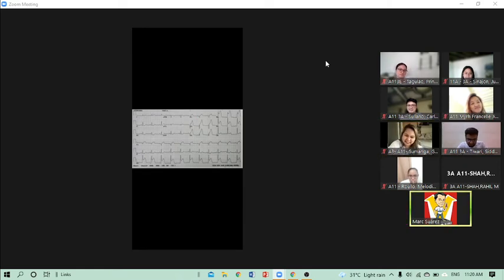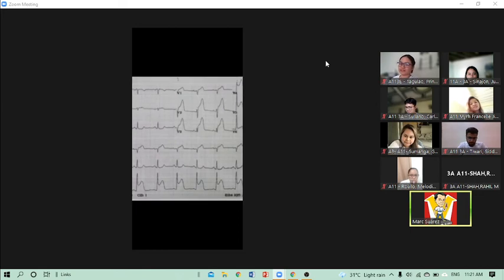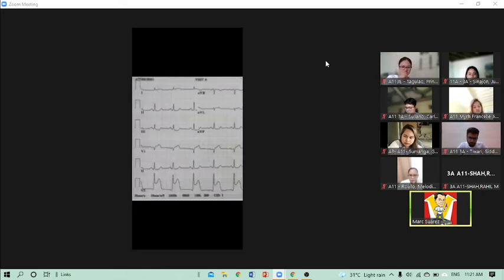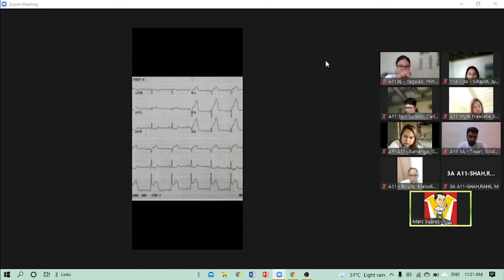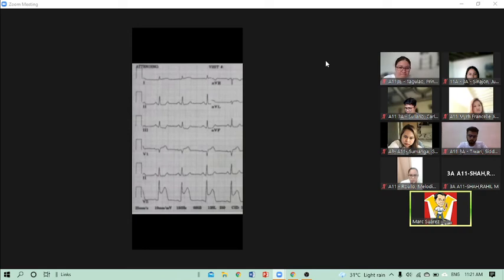Okay. I want you now to see this one. It's very evident. This is lead V6, right?